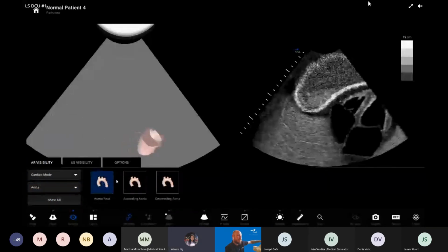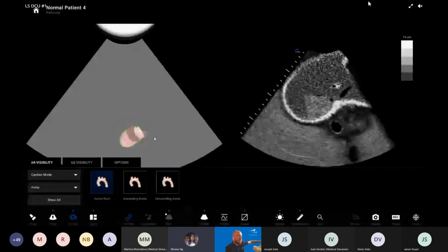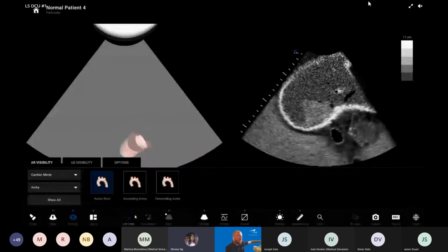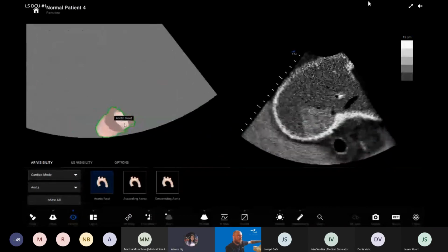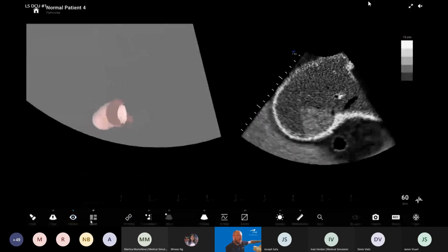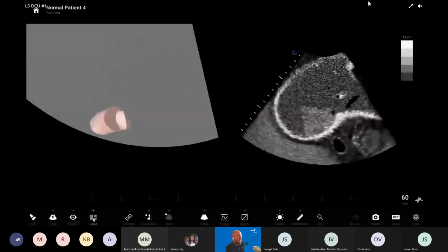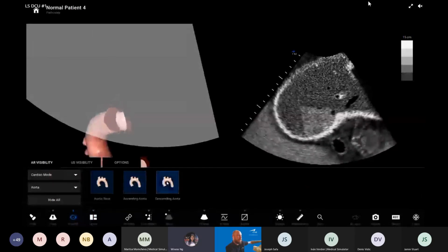So over here, you could build up the cardiac structures bit by bit if they want to know more about the anatomy structures in the cardiac. So this is how we can present just parts of the heart, because as Winnie mentioned, it's now over 150 intracardiac heart structures.